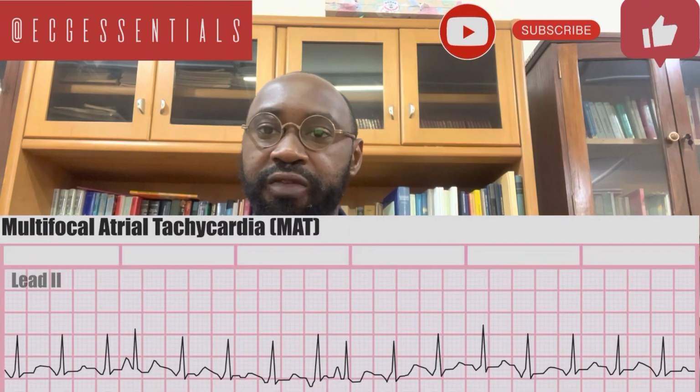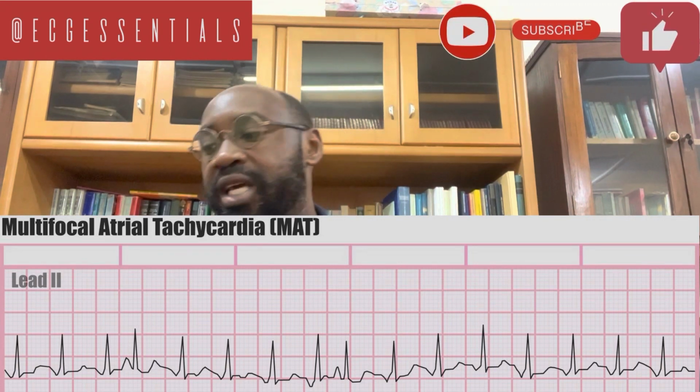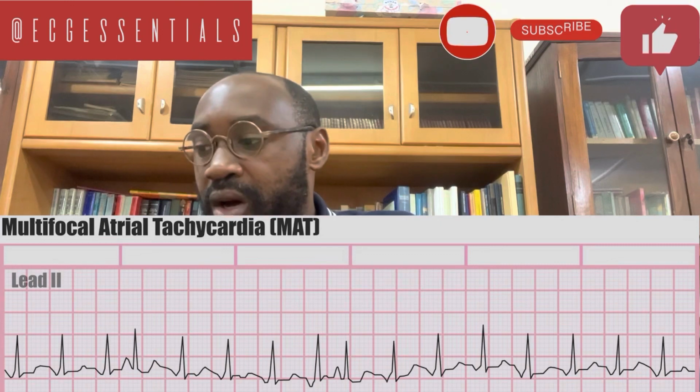We mentioned earlier that because these are not coming from the sinoatrial node, we do not expect that the P waves will look like those coming from the sinoatrial node. So if we were to see some of these inversions in the context of ectopic beats, then it gives us an idea of what is going on. And then also pay attention to some variable morphology of the P wave. The P waves on a particular ECG may look totally different from each other. One will look different from the next, and the next will look different again, and that may be the case in conditions like multifocal atrial rhythms.